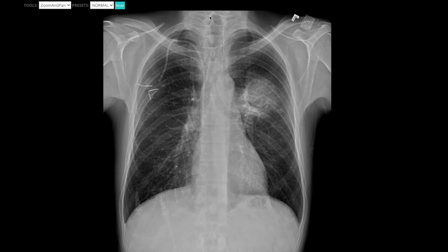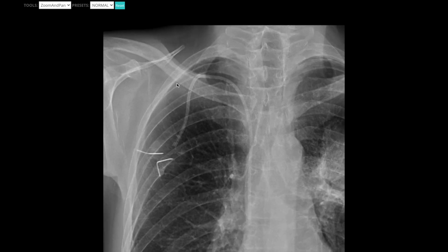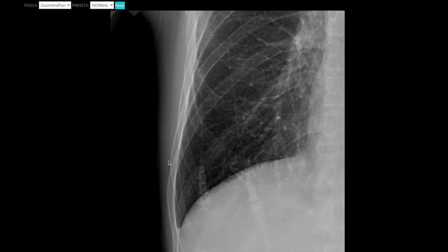Next thing, after we've looked at the mediastinum and the airways, I usually go through the lung. And I always start with pneumothorax, and I always start with pleural effusion. So the places that you want to look for the pneumothorax, the first thing is going to be the apices, and these are going to be best seen on some type of expiration view, right? Because that's when the lung is going to collapse the most. When your lung is expiring and collapsing, you may see the border of a pleural line in the apices. You can oftentimes see them in the bases as well, so don't just look in the apices.